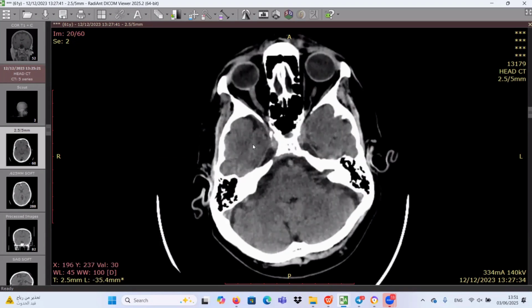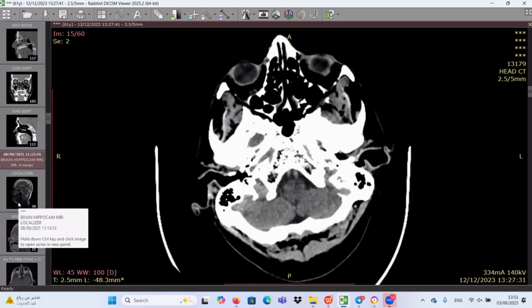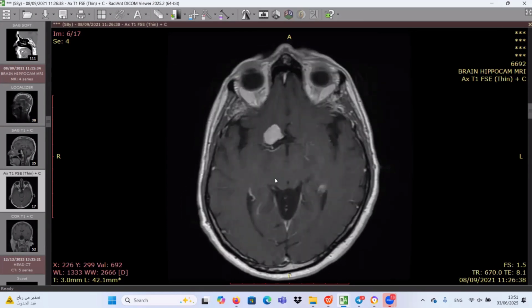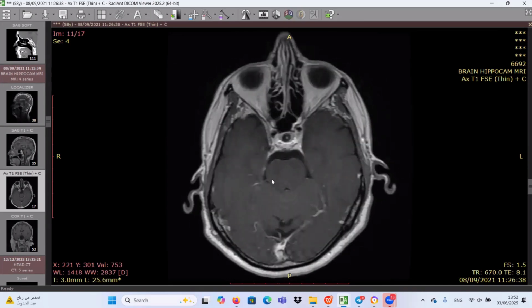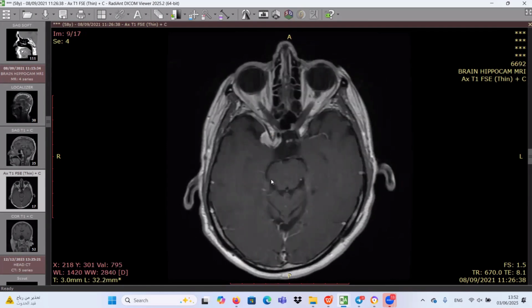Okay. MRI. Okay, I will give you the MRI. Thank you. Just a minute. Really, we did the MRI for the case. Okay, in this contrast enhanced T1 weighted MRI images of the brain, I can appreciate that there is an intensely enhancing lesion along the right paracavernous location. I think it is superior to the cavernous sinus. This is the site of the cavernous sinus. It could be supraclinoid, involving the supraclinoid portion of the internal carotid artery. I think it's also dural based and extra-axial, based along the anterior clinoid process.